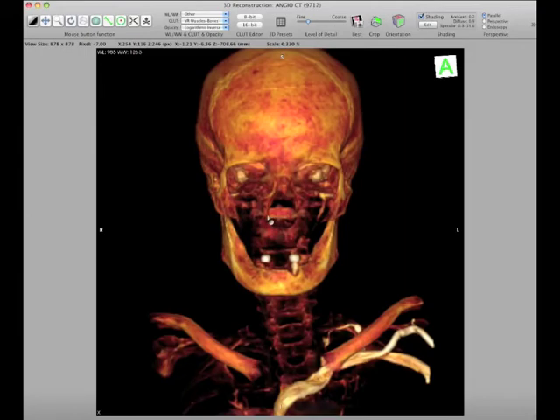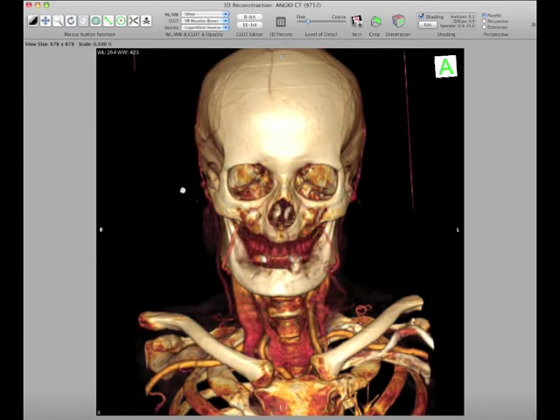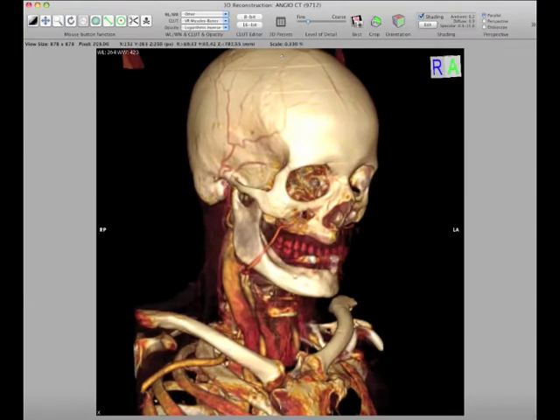And then the bone removal tool, to do that we'll have to see bones, so click on this, and what you'll do is you'll get to where you see this. I'm just adjusting this by clicking and dragging left and right. Okay? Let's say we wanted to remove the collarbone. Click on the bone removal tool, click on the collarbone, and it removes it for us. So we can zoom in there and see it.